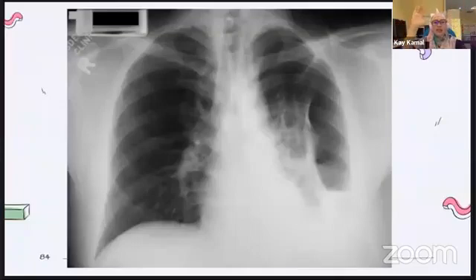And if you have a lateral chest X-ray, you are giving even more layers for you to imagine. So it's a lot of imagination involved in interpreting a lateral chest X-ray.